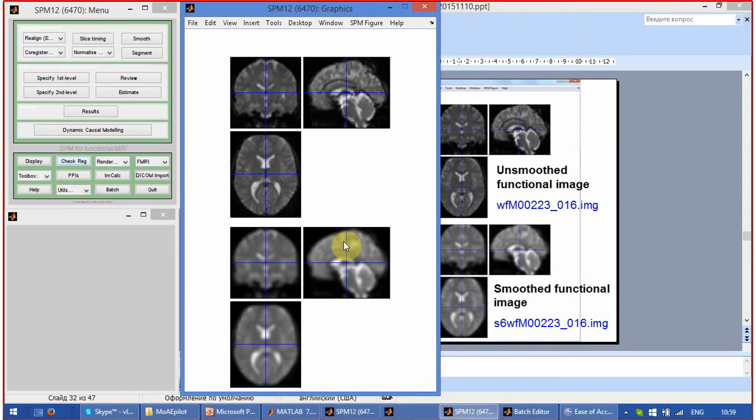I think they will be pretty different, with a lot of so-called false positives in the shape of single voxels which look activated but in fact are just artifacts, and they will be scattered all around the image and even outside the image. But this is something to be tested afterwards.